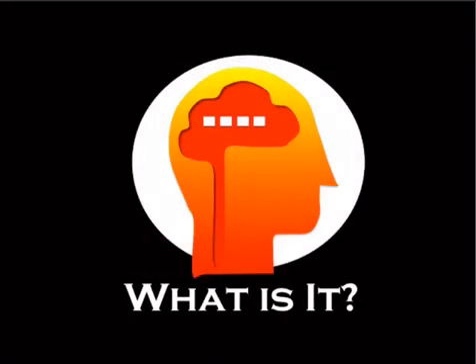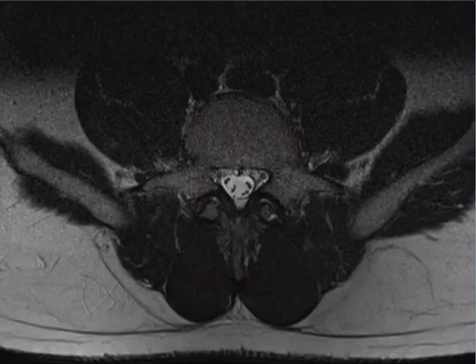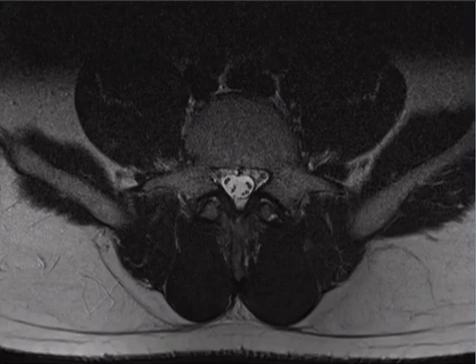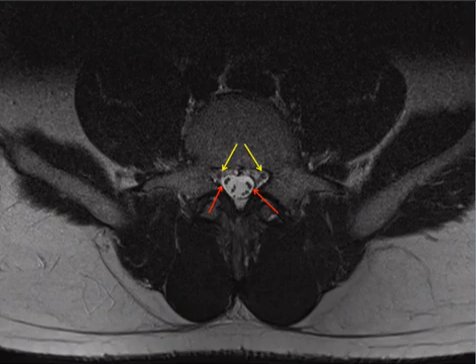Okay, so I'm going to cover a confusing topic that also lends itself well to multiple choice. Here is an axial T2 through the lumbar spine, and I just want to point out to you that there's a bunch of different nerves at any different level. So we've got yellow nerves here that are on their way out, they're exiting. And then we've got these red nerves here that are on their way down to exit at the next level. I call those descending. And then there are some other nerves too for the different levels as we go.